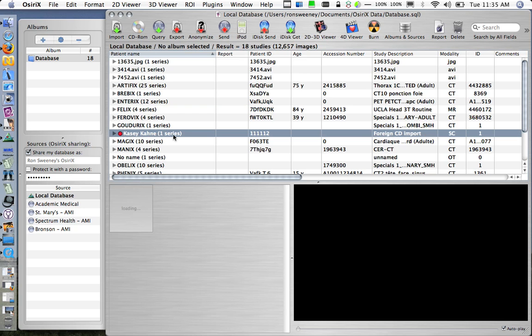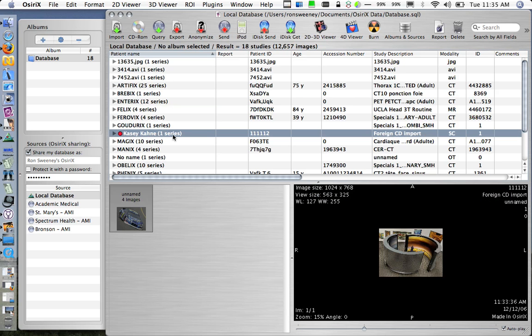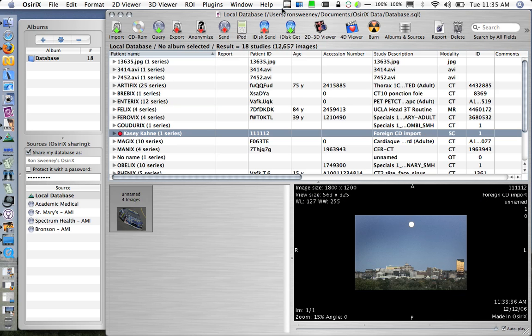So that's it. There's our patient. I hope you found this useful, and have fun.